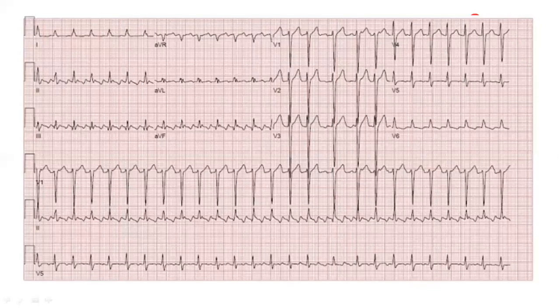So this is a 12-lead ECG for you all. And you see this is tachycardia. Obviously, the first thing that you will see is that this is narrow complex. And you see that it is regular, and then it becomes irregular in between, and then regular. So it is not bizarre. It is not completely irregularly irregular, and so it does not fall into fibrillation, right?